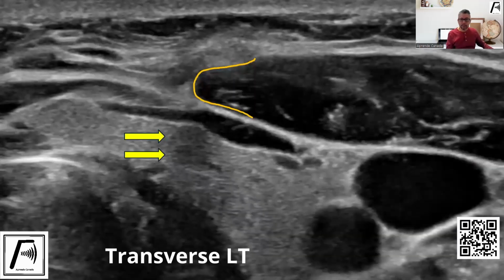And here's an example where the shadow actually does look like a nodule. You can see how it has sort of an ovalish shape. And so in this particular case, that could be very confusing. We don't want to create things that are not there. And again, for someone who's new at this, they may jump to the conclusion that there is something wrong.